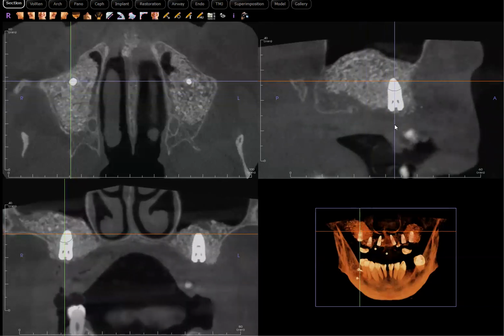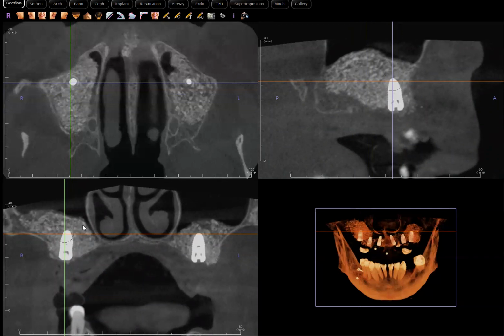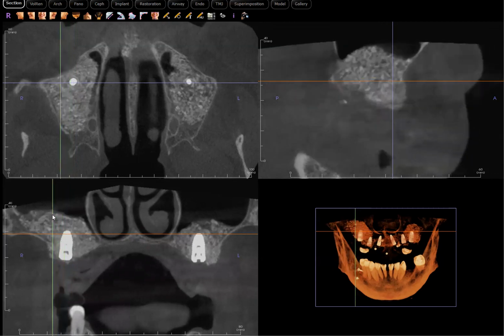should be recognized. I have seen some other sinus lift procedures where the provider did not place enough or an adequate amount of graft, or sometimes due to significant inflammation, it failed to integrate with the surrounding bone. But in this case, that's not the case.